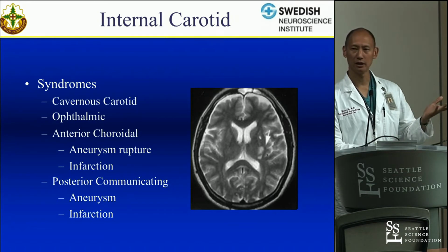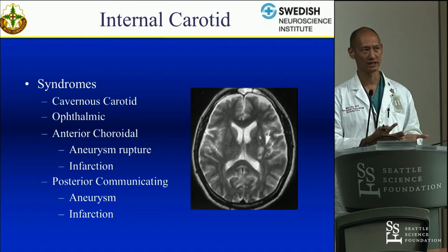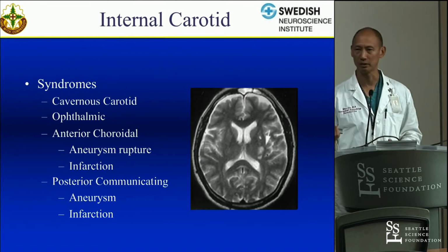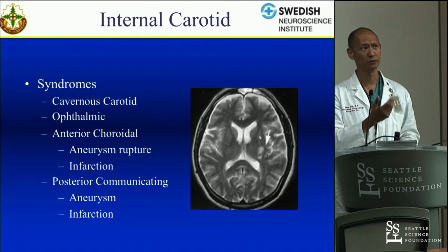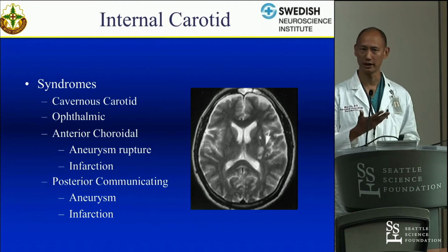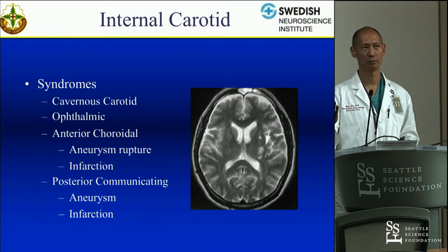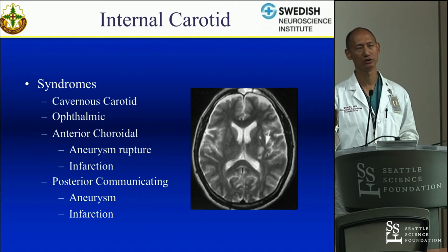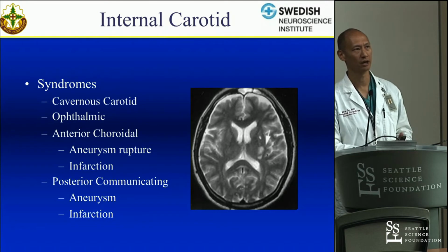Posterior communicatings can have perforators that arise from them, typically from the anterior side of them. If you decide to coil a posterior communicating aneurysm, and there's a big enough P1 segment on that ipsilateral side, if you occlude that posterior communicating, usually the posterior to anterior flow is enough to supply those perforators. But the more anterior the posterior communicating is, the more watershed it will be, and the more likely the anterior and ventral portions of the thalamus are going to be at risk.